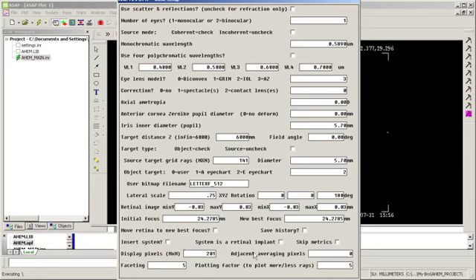If the system that I'm inserting is a retinal implant, I select that because that puts it inside the eye. I can opt whether or not to skip the default metrics that are generated with the eye, which are various measurements of quality. And here are some options that I can use to set the display. So I can have a 201 by 201 pixel display.